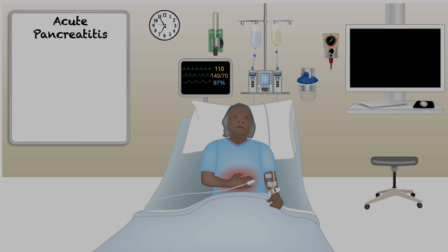Here is a woman who came in with acute pancreatitis, and she may have excellent recovery if she had just mild interstitial pancreatitis, or may end up being in the hospital with a complicated course if she developed acute severe necrotizing pancreatitis. So how do you differentiate these two forms?